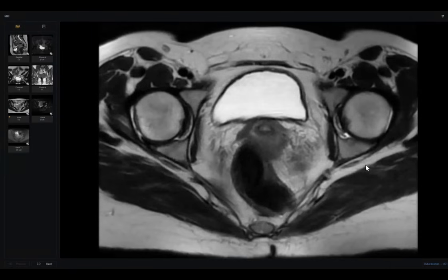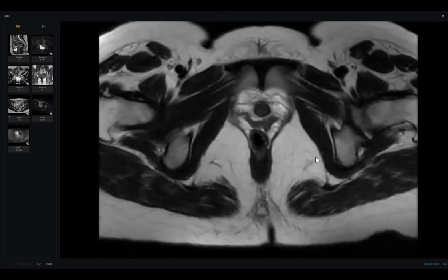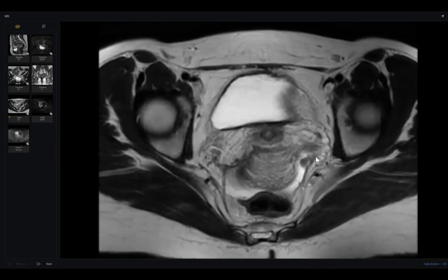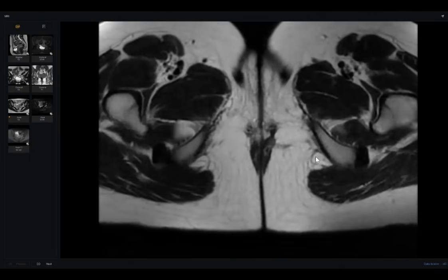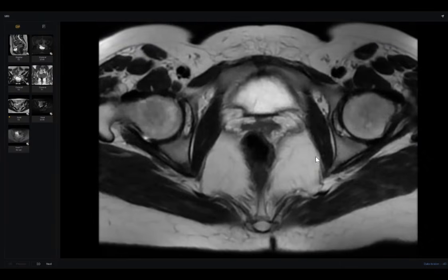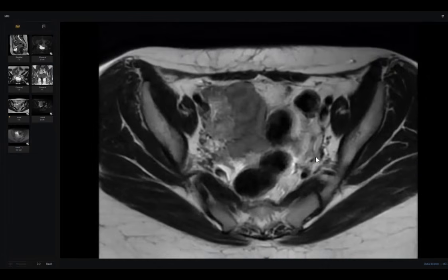The images are jumping very fast. Can you scroll, sir? Because if I try to scroll, they jump very fast. Yes, sir, no problem. Let me add the slice of interest for you. Thank you, sir. I'll quickly go through the entire stack of images.